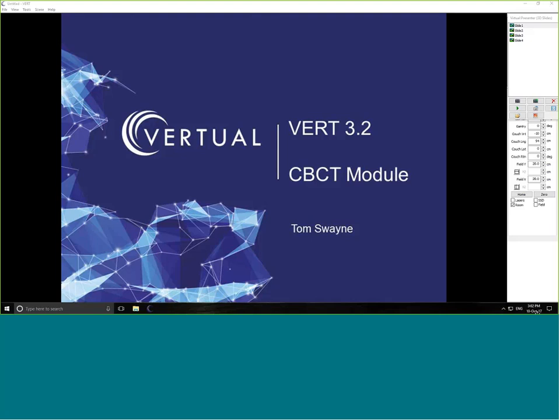So as Jan did say, we are looking at the CBCT module. This is going to be a huge factor in the 3.2 release of VERT, something we've been working very hard on, and I wanted to introduce that to you all in this webinar. There's quite a lot of functionality that goes into it, so everything that you see here, if you get 3.2 when that's released, then you will be able to recreate everything that you see in this webinar.